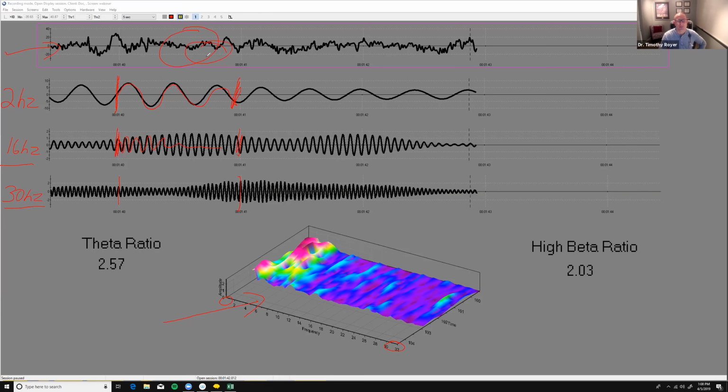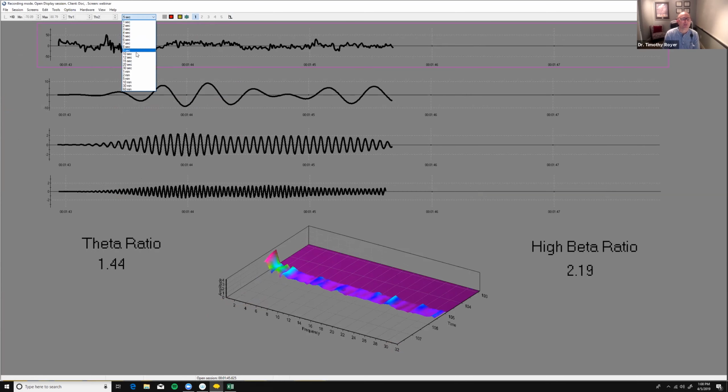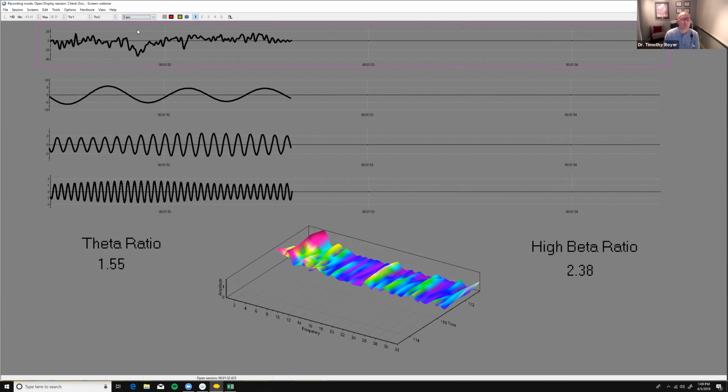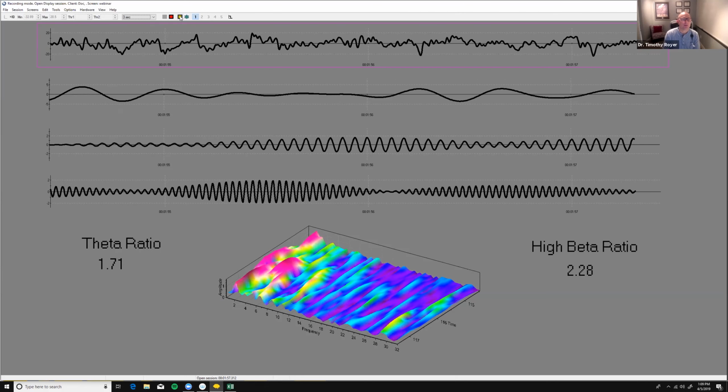We're not really concerned much about that signal. We're concerned about the distribution of these cycles. So let's look at this again. And I want to drive home one major point before we really start to talk about biomarkers here. So let's let this run. I'm going to move it to even shorter. We're going to go to 3 seconds, and then I'm going to pause it.